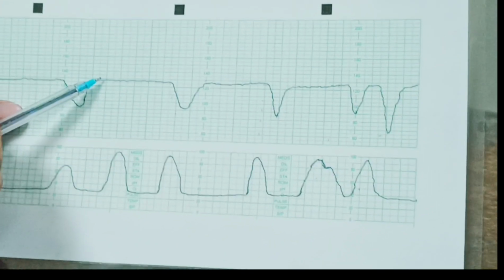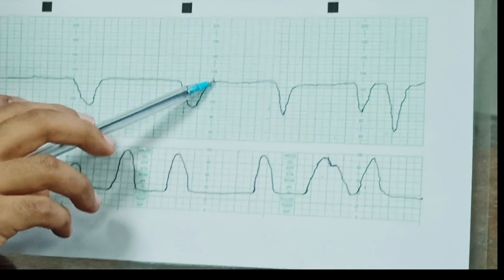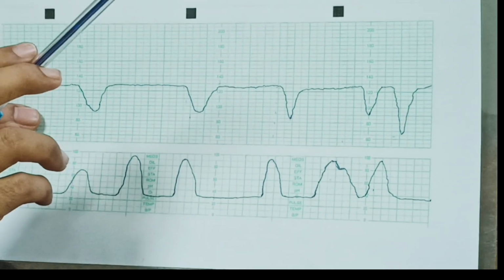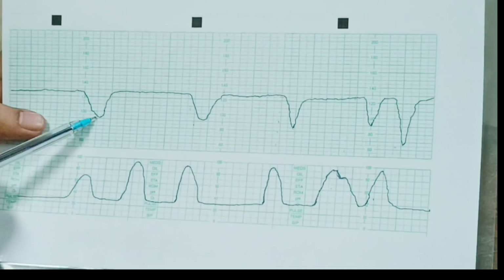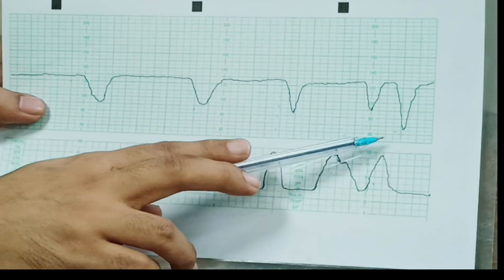Now this trace will have, what will you say? This is a cardiotocogram showing fetal heart rate of 130 beats per minute, which is reassuring. Decreased variability of less than 5 beats per minute, which is non-reassuring. Then there are decelerations. There are 5 decelerations. And each deceleration is after the peak of the contraction, you can see. So these are late decelerations.